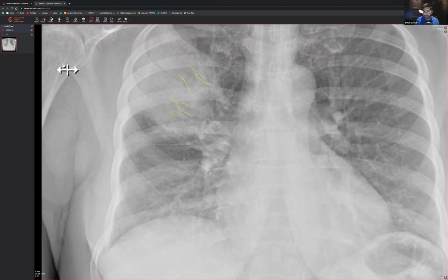So I'm going to draw on here first off. When you're looking at the air, they look like little nets. They look like a net, right? And then within that net, there are little dots. They're like that because actually they're like little cylindrical bottles. Let's say they look like bottles, right? And those little dots actually correspond to tubes, and those tubes are the bronchograms.